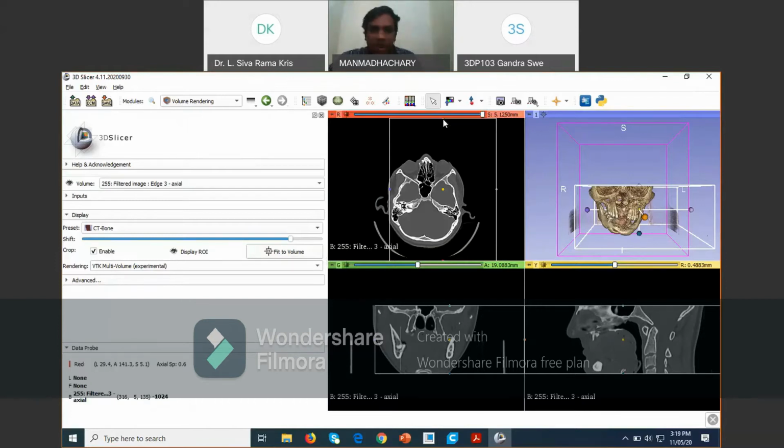Here I'm telling how we have to extract and what the theory is, which volumes are being used. Next, I will give only step by step using our manual. Now I'm cropping the images, adjusting here in this case.